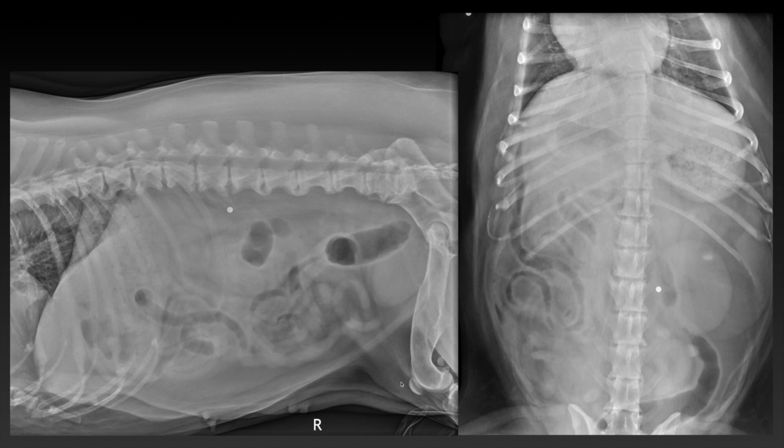So my comments for this case are the following. The focally reduced abdominal detail, the widened gastroduodenal angle, and the displacement of the descending duodenum are indirect signs for a pancreatitis. This could be potentially associated also with duodenitis and gastritis, and I would recommend to do CPLI and an ultrasound of the abdomen to confirm a pancreatitis.